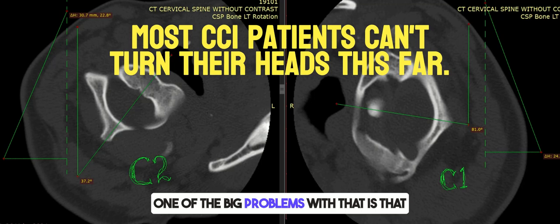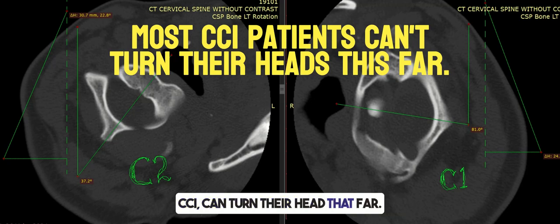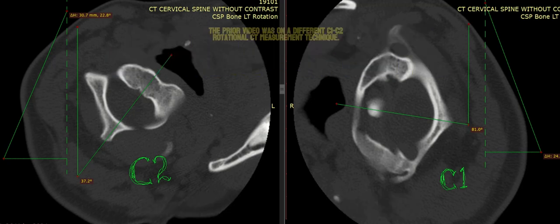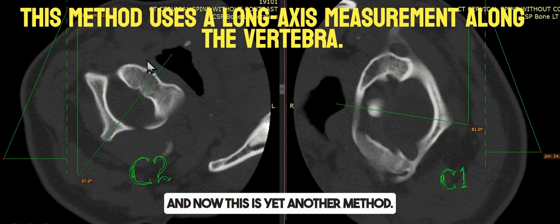One of the big problems with that is that very few patients other than hypermobile patients that have CCI can turn their head that far. But if we forget about that for a moment, I did one video on a different method for measuring C1, C2 on a rotational CT, and now this is yet another method.